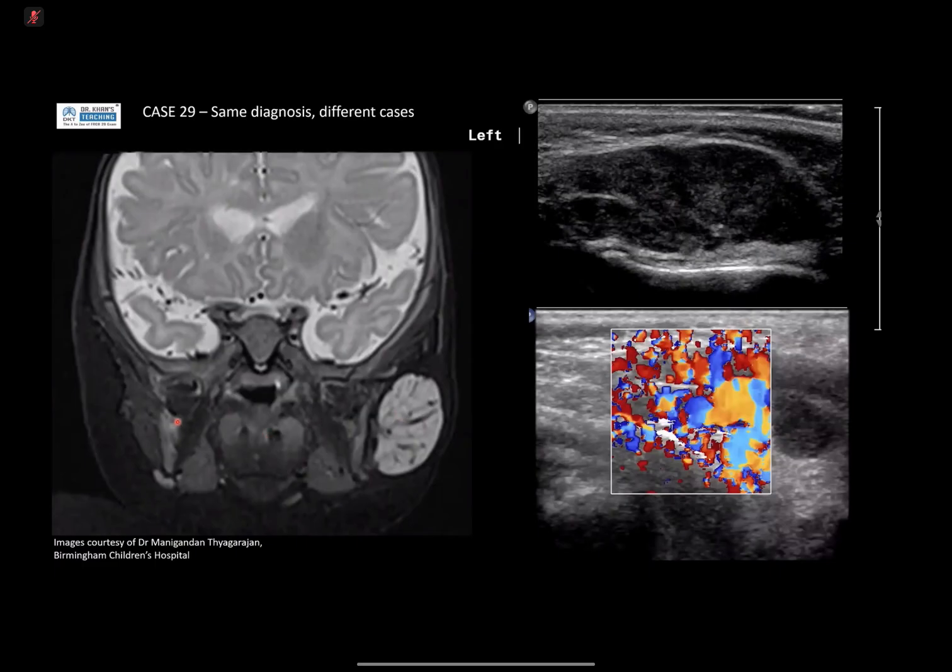I think you mentioned this might be parotid. Good thought. The only thing here is that because I haven't given, I think this is a fairly well-centered coronal view. If it was parotid, you should be able to see the other parotid on the other side. I'm not sure you can see it here. But this is just an example to show a craniofacial hemangioma. Okay, so again, very heterogeneous, but fairly well circumscribed lesion with quite a lot of vascularity. It can happen anywhere.